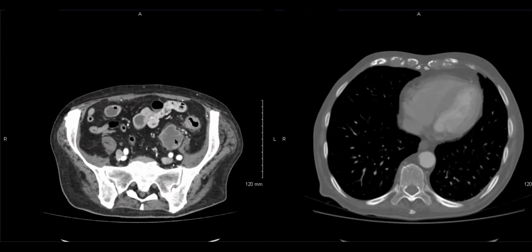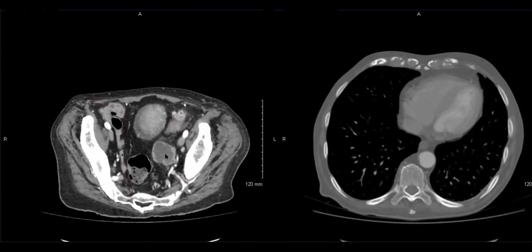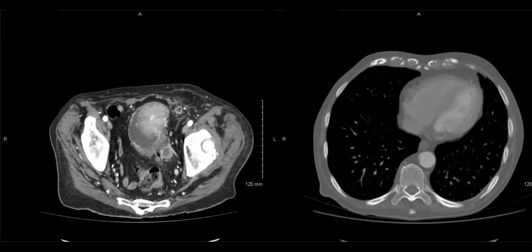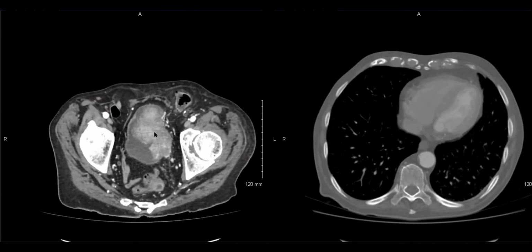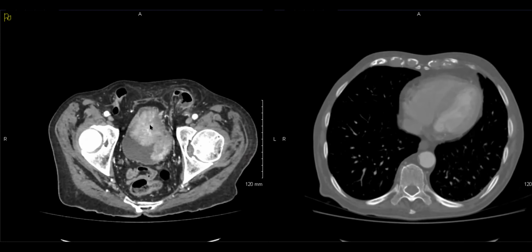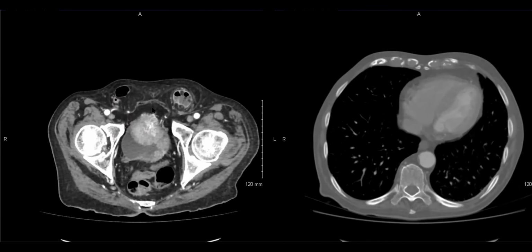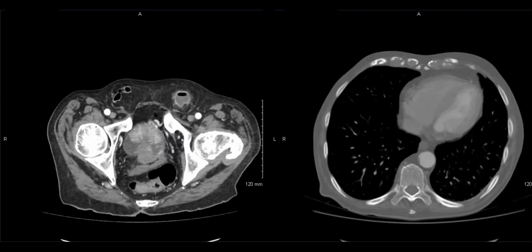You can see this is TCC just broken off from where it's supposed to be, and here's another one, and then you go into the bladder, and you have these big things. So we're reading the case, and you can see a beautiful demonstration of how TCC grows in the bladder. So just in and of itself, this was a cool case.